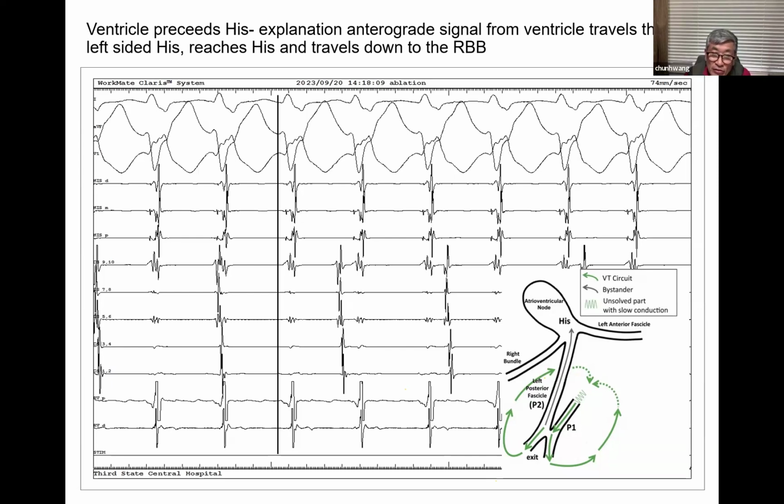Almost the same thickness as the left ventricular side, more towards the septum, the posterior papillary muscle area, maybe. That gives you the same transseptal activation through the septum because of the papillary muscle. And then your His bundle, right bundle activation time is about the same. So there are many features in your case, and I am not sure this is a fascicular VT.